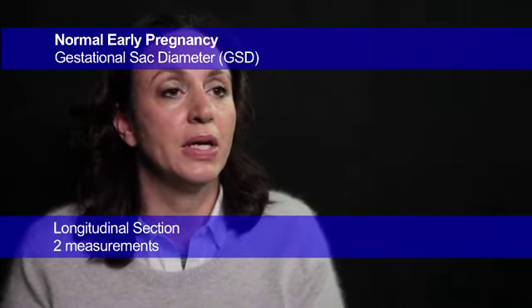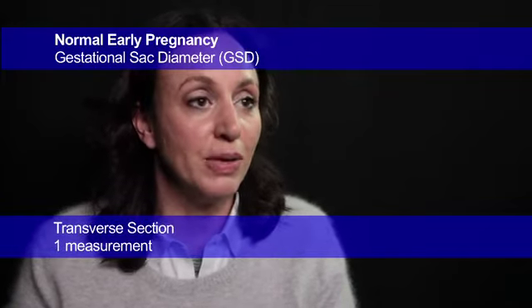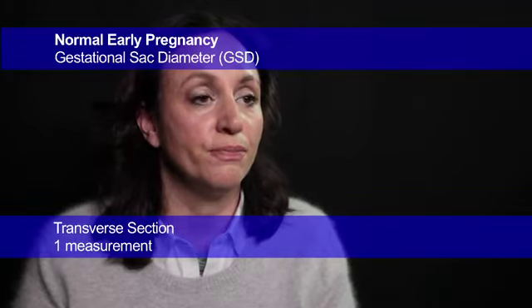So when we look at the early pregnancy scan, we talk about the gestational sac diameter. This is a measurement taken in two planes. In the longitudinal plane, there are two measurements, and in the transverse plane, there is a third measurement. These three diameter measurements help to define a volume.